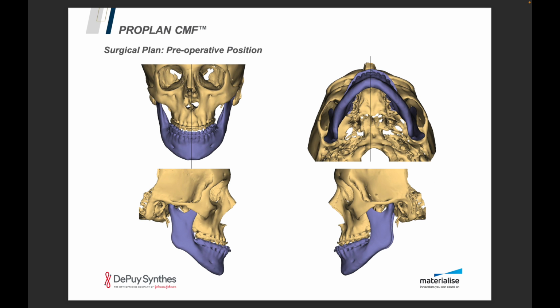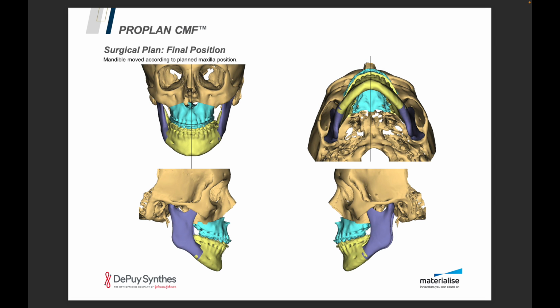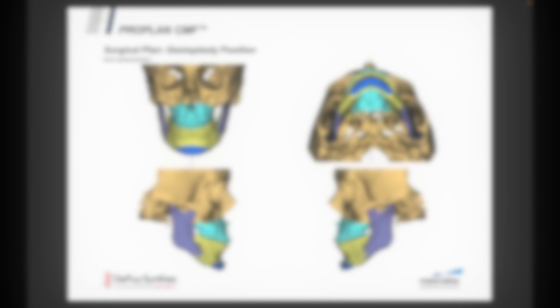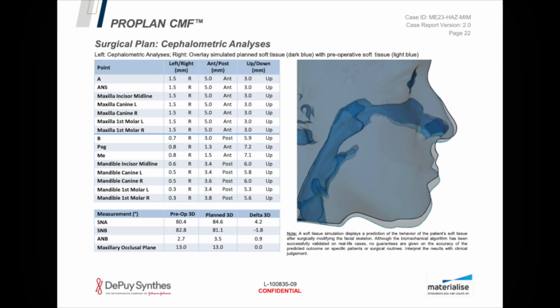I use virtual surgical planning for cases such as these. We can see the maxillary advancement there in blue and the mandibular setback. He has a small horizontal microgenia, so a sliding advancement genioplasty will address this, as well as further shortening the lower anterior face height.